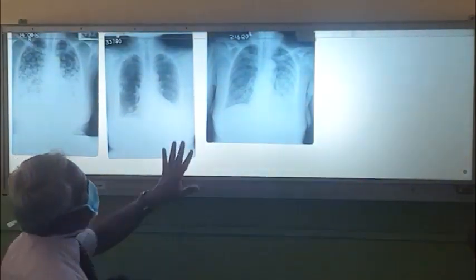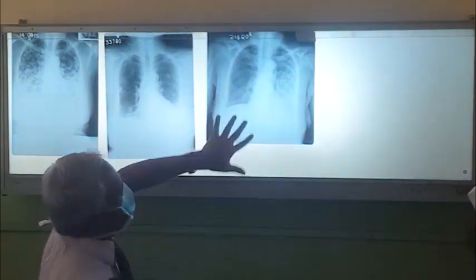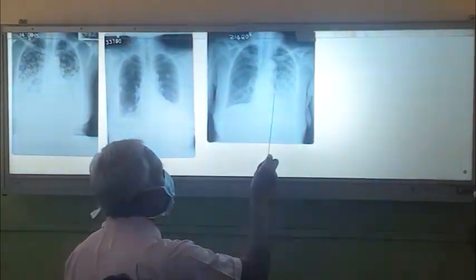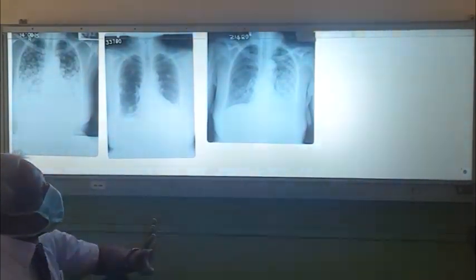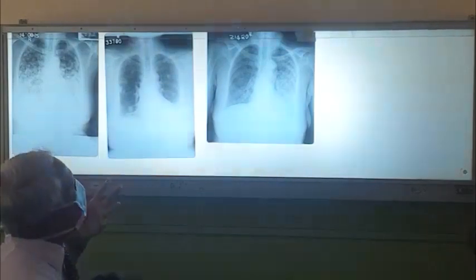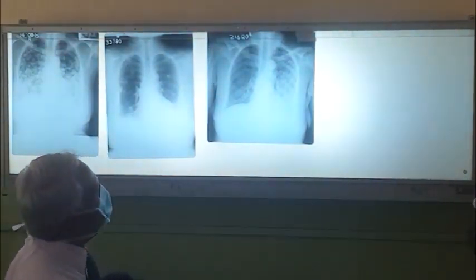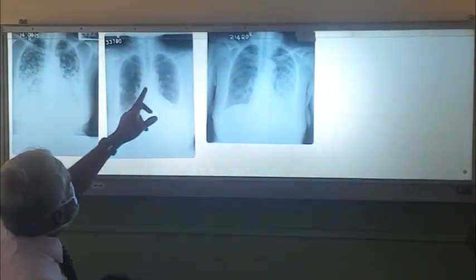Right. So this is what is called miliary, so 2 mm or less, widespread opacity, right? This X-ray is well centered, but you can't see the intervertebral discs through the cardiac shadow. So this is underexposed, right? And maybe an obese female patient, you can see the thick chest wall, so with miliary mottling, right? Here again you can't see the intervertebral discs.